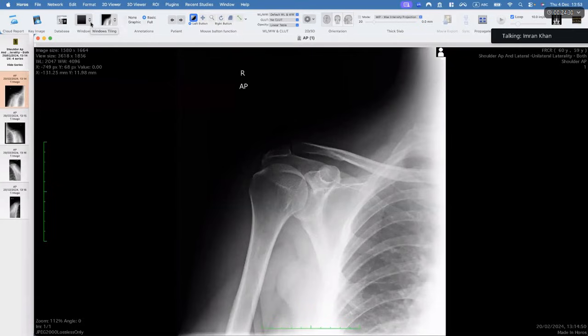Okay, 59-year-old male. I've been presented with the X-ray AP view of the shoulder joint of a patient presenting with shoulder pain. First of all, I'm going through the image. I am looking at the humeral head. There is slight lucency projecting over the greater tuberosity. It may be projectional. I will confirm it on the further image. Going through the clavicle and acromioclavicular joints, they appear normal. There is normal congruity of the glenohumeral joint.